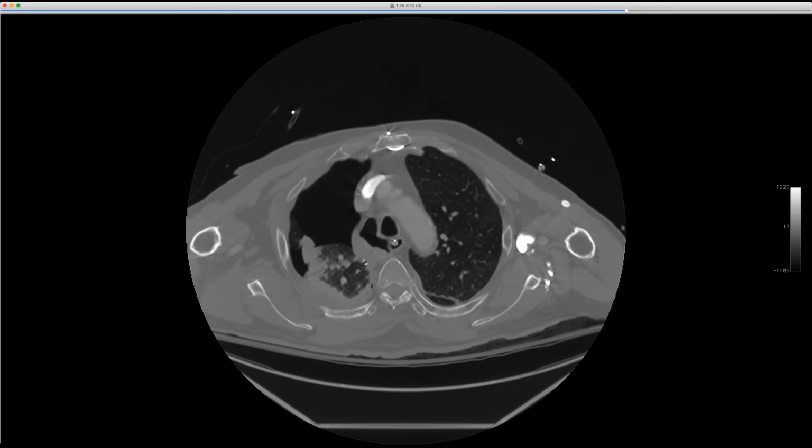I mean, the fissure popped back into the lung. So it's probably not a complete separation at the time. And as the lung came up, it just took the path of least resistance. But very cute. So this is reincarceration of the azygous vein then?